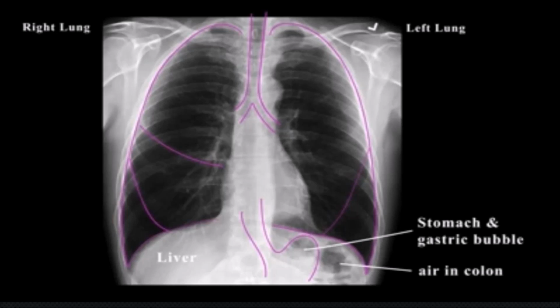If you look closely at the lung fields that are completely black, you will see fine strands of white in them, nearer to the edges. These are the pulmonary vascular markings, and they come in later when looking into pneumothorax or collapsed lung.